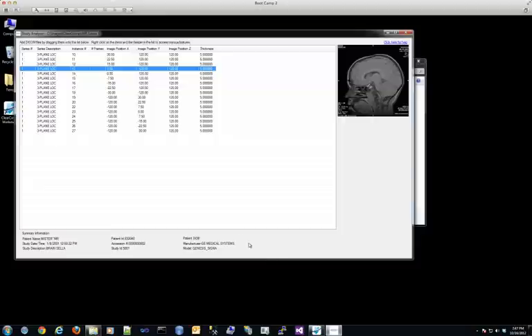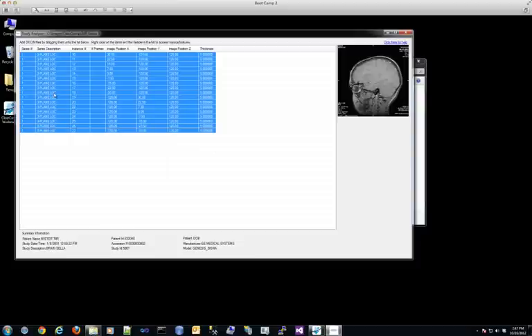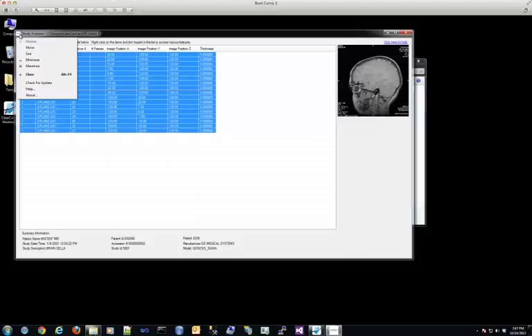The last feature, even though this is an advanced feature, we're not going to cover it because it's not actually a completed feature. You notice on the right-click menu there's a Save Multi-Frame Images to Video file. That tries to use FFmpeg to convert. It extracts the images out and runs it through that to convert to a video file. We're not going to explain that because it's not working fully right now, so ignore that. But that's what that does do. If there's demand for that, I can actually finalize a feature and get it out there for you guys. But that's basically all the features on here.